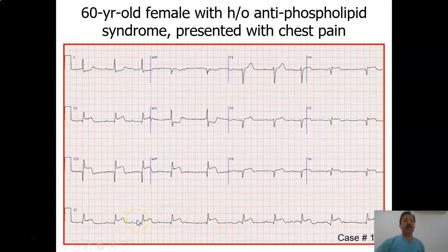So it's like 50 or 60 beats per minute. But the important thing is the rhythm. The P wave is followed by the QRS complex with a normal PR interval. The next P wave with QRS has a prolonged PR interval. The next has a more prolonged PR interval, and then this P is not followed by a QRS complex. Then the cycle repeats itself again. So this looks like second degree type 1, or Mobitz type 1, AV block.